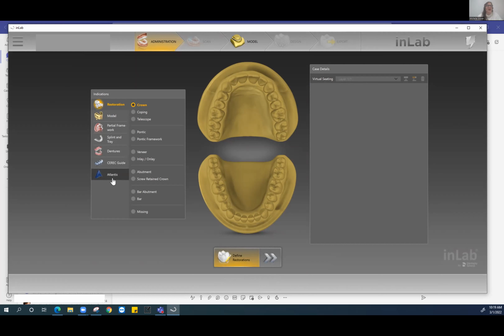to the portal. And we've got great support here in Canada with Atlantis, where you're able to, of course, have somebody help you out if you need any assistance in uploading your first case, or looking at the initial proposal that they provide you before you accept the case. Really great support that you can get for the Atlantis functionality.